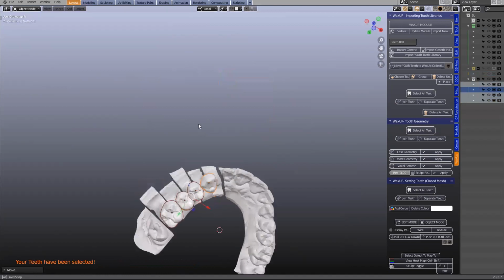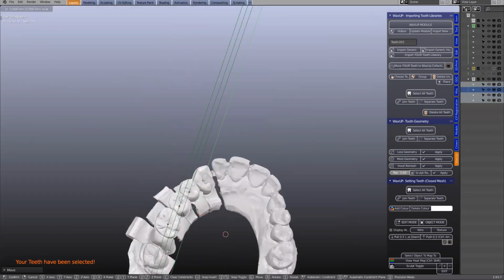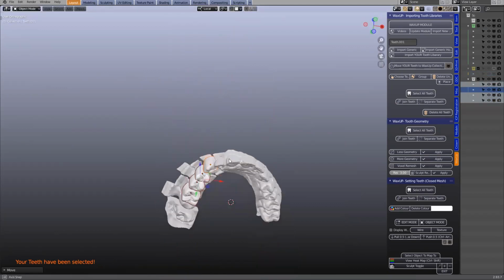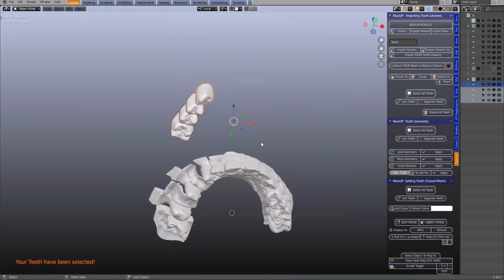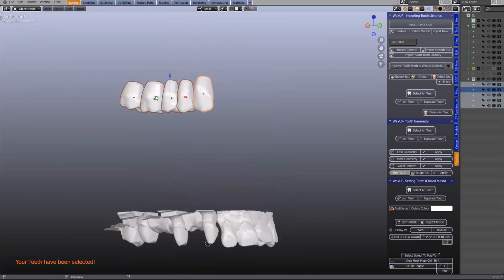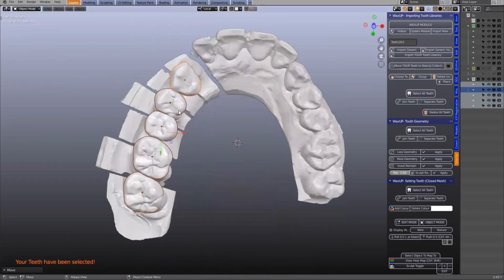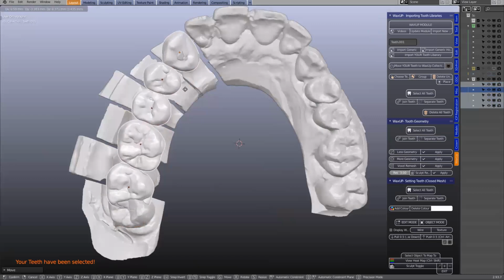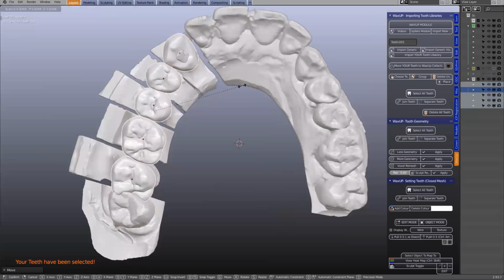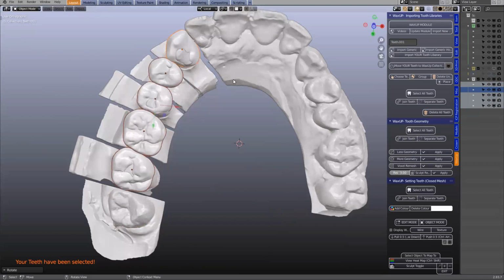one short, isn't it? Yeah, I think I'm one short. I am one short. I'll just go back a few steps. I'll take this one as well. Delete unwanted, put them into position. Now this is exactly like what we usually do with a wax up. We're using the G key and we're using the S key to scale, and then the R key to rotate. And that shouldn't take you too long.